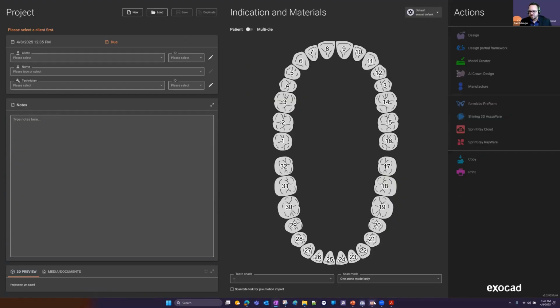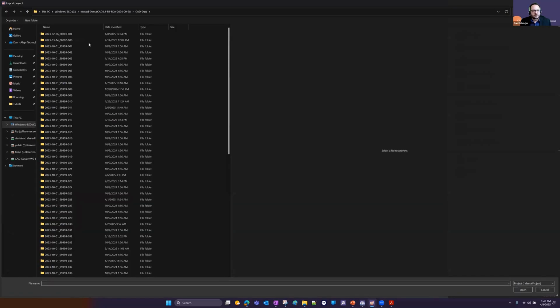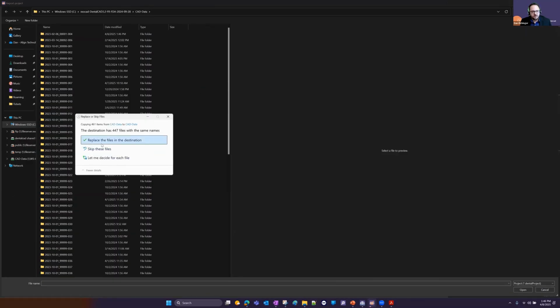So now I'm actually within my DentalCAD software. Now, for those of you that have both softwares, you can combine the DB. So if you don't want separate databases, you can combine that. So just reach out to your friends at Zahn Dental, and their technical team will be able to help you out with that. And then from here, I'm going to go to the load screen, and I'm going to import from exocad project. Now, I copied that file earlier, so now I can paste it within my database. And it looks like I've already placed that in, so I can replace the files in the destination there.